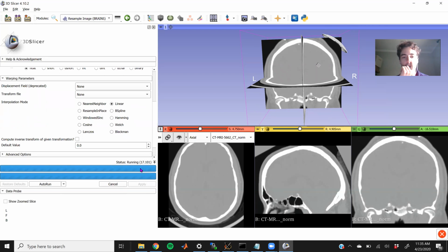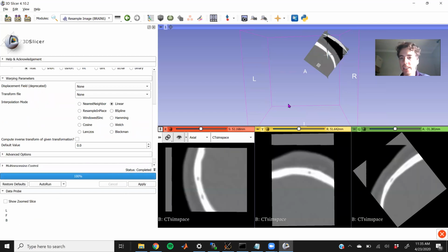It's taking a while because it's upsampling the CT to match the resolution of the transducer. So now you can see that we just have a CT file, which is the same as the extent of the transducer. And so we'll go with this for now.